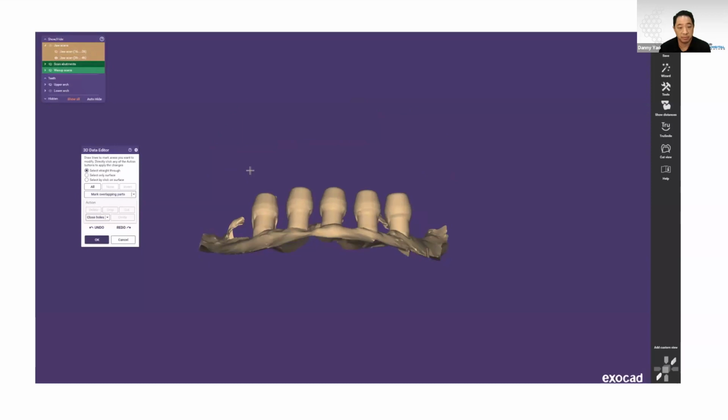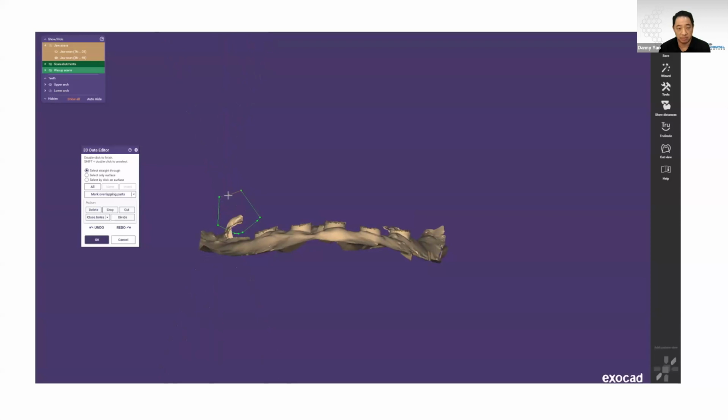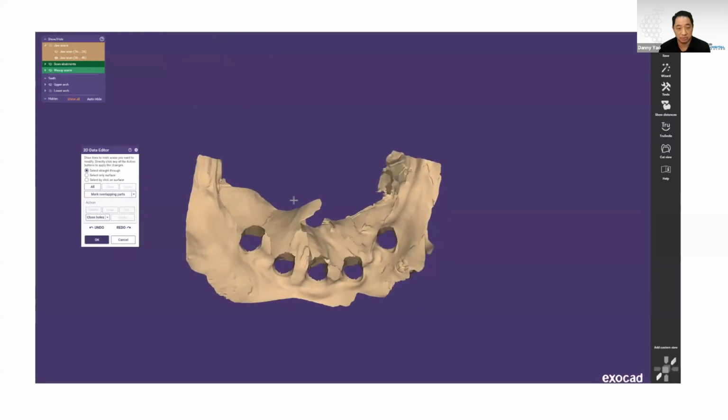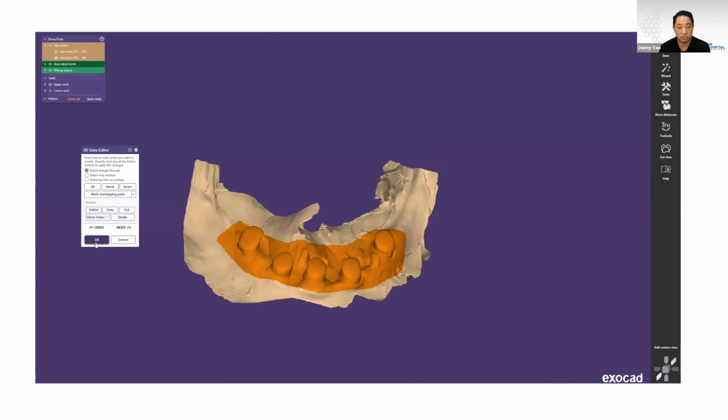It's always annoying that everything pops up at the same time when you're trying to turn on and off the different things. This is just a way to delete everything all at once. And then we're just going to fill all the holes at once as well. It's a little bit more efficient and easier than the upper. Close holes to close them all.